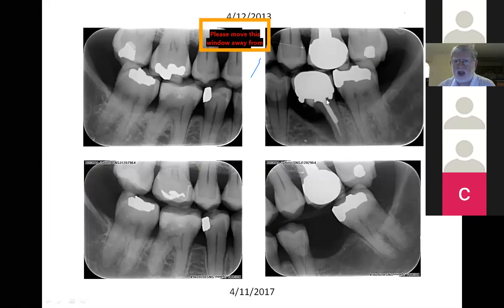But in this particular case, I think what will have happened is when I first saw this patient many years ago, what's that, pushing 7 years now, when I investigated, this is what we saw, swimming in a sea of a lot of yuckiness, and it's been posted, it's been root filled. I would imagine it would have been root filled, posted, it cracked, and it was decided, okay, let's try to buy this tooth more time. They've taken out the fractured root and let it sit on here. Of course, that tooth came out pretty much straight away.